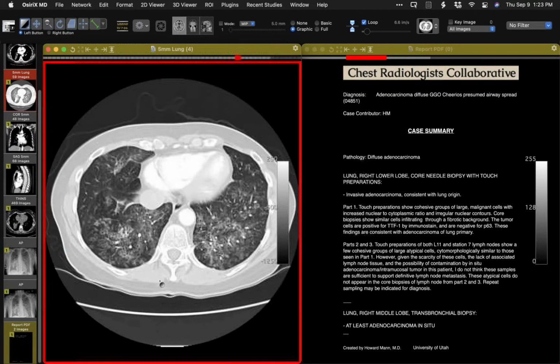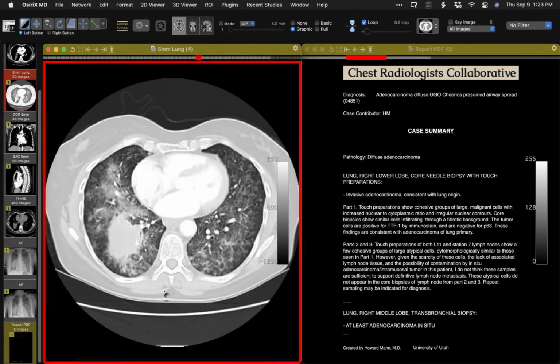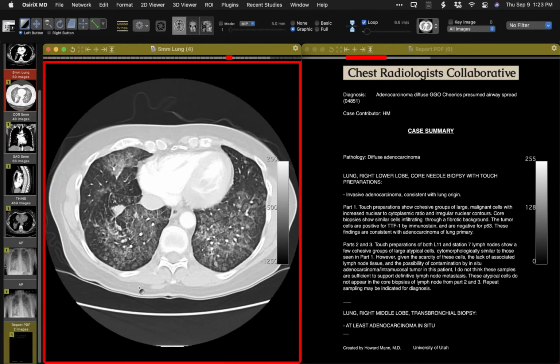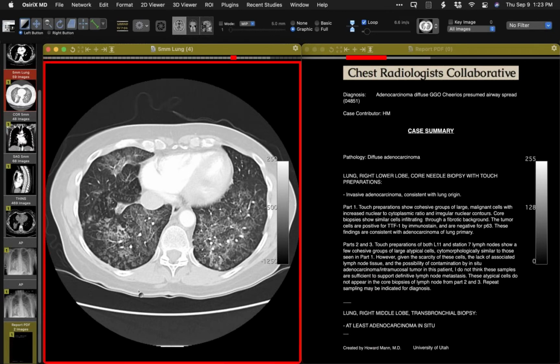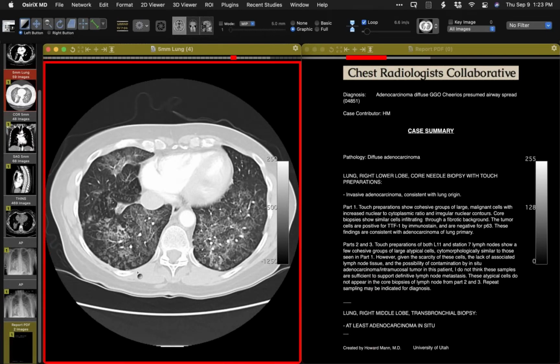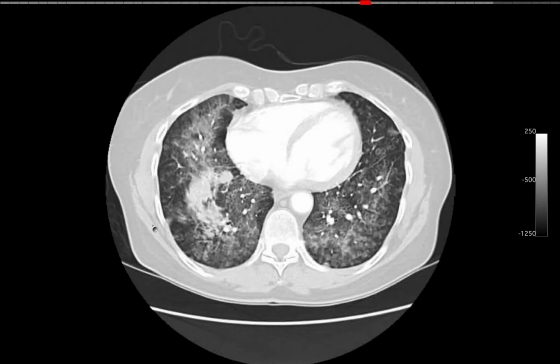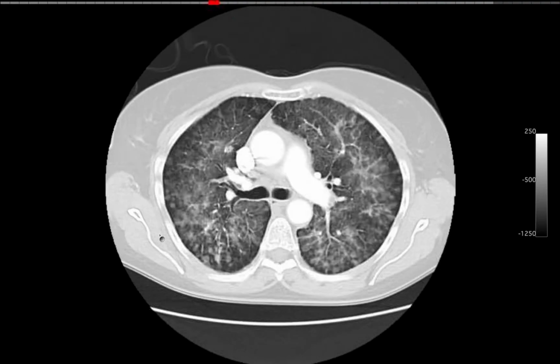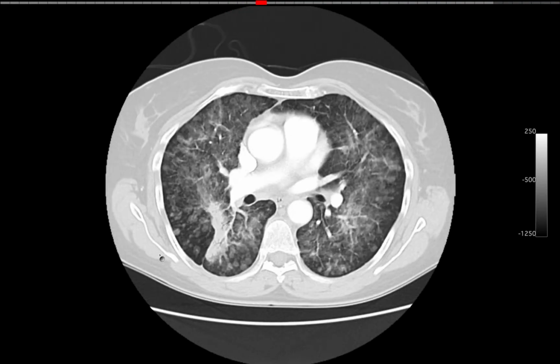Typically, if you were thinking of the entity of mucinous invasive adenocarcinoma and take away the big mass, we can see a pattern that looks just like this. But typically, those are actually KRAS positive and tend to be TTF1 negative. So any comments or thoughts about this pattern? Would everyone agree it's probably aerogenous spread? Cells are carried by secretions to all parts of both lungs from the mass?